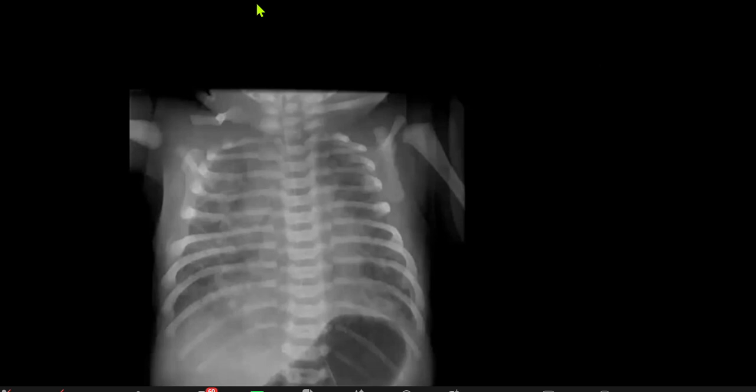Another neonatal chest radiograph. There's a normally sited NG tube. There are bilateral pulmonary abnormalities with quite large granular opacities. I would like to correlate with the clinical history, particularly if there is a history of difficult birth. This could represent meconium aspiration.